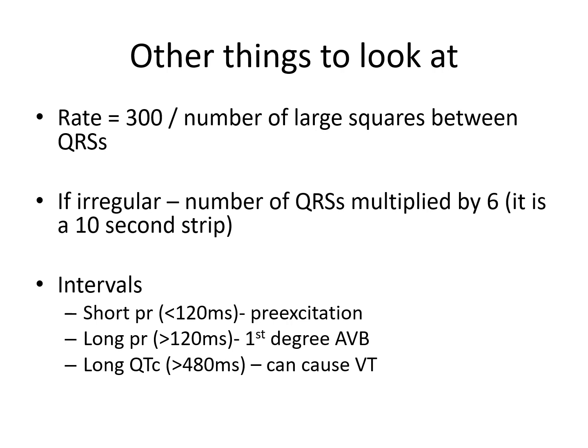And then finally, if we have the QT interval, which is corrected for the heart rate, if it's approaching 480 or 500 milliseconds, we should start getting a little bit concerned, because if it gets prolonged much more, it can lead to polymorphic VTAC.